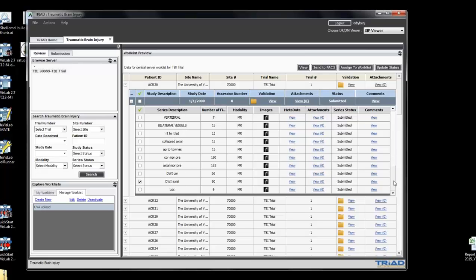Okay, so the goal of the grant was to show the interoperability. So, for instance, if you have a site in Iraq and Afghanistan and you have data that you want to load, you want to be able to load the data sets quickly in the cloud and assess whether there are lesions in the specific subject. So two things here. We have Triad that allows us to load the data sets in the cloud and be actually linked to some platform to read the data specifically.